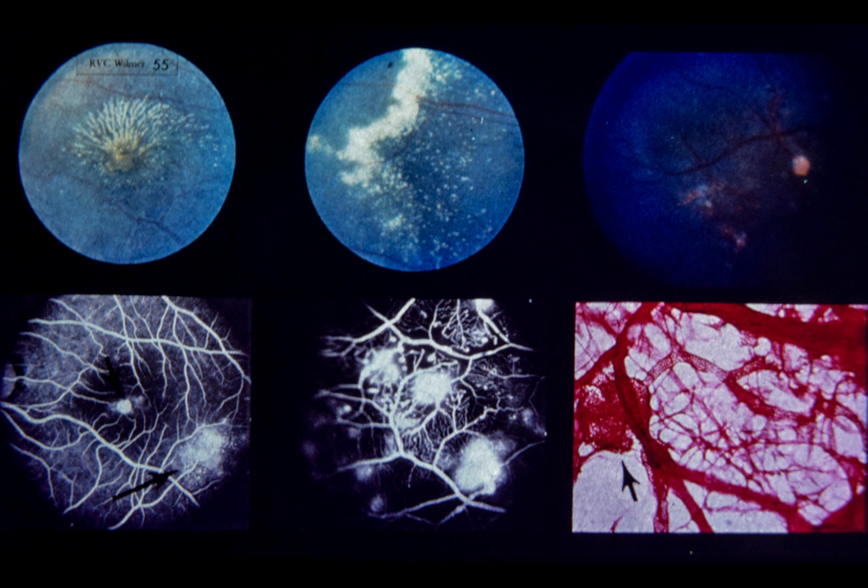Upper right, note multiple areas of telangiectasis involving both arterioles and capillaries. Lower left, fluorescein angiography of left macula. Small arrow shows early staining of fibroglial nodule, and large arrow indicates leaking telangiectatic vessels inferotemporal to the fovea. Lower center, note dye leakage from telangiectatic vessels and areas of capillary closure adjacent to telangiectatic vessels.